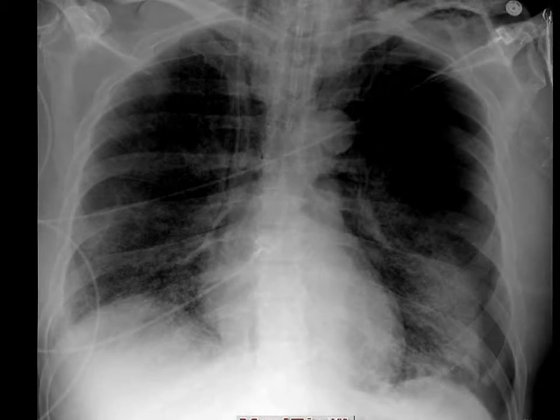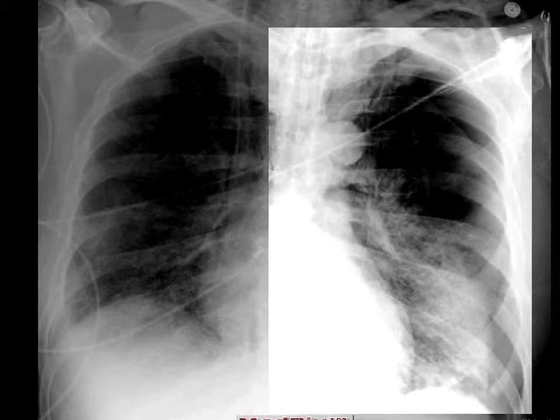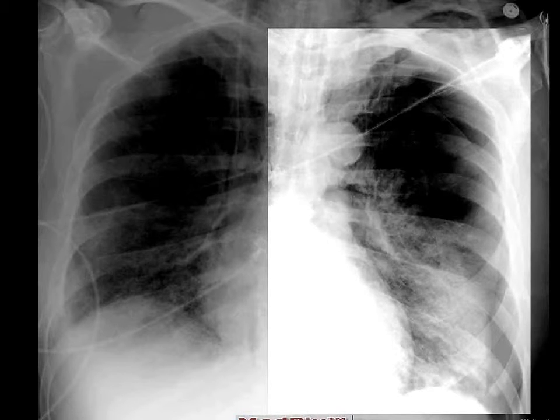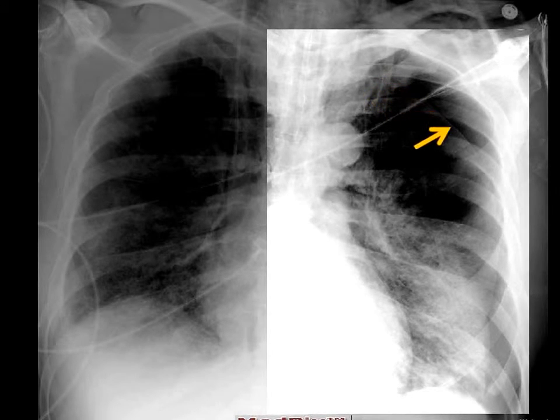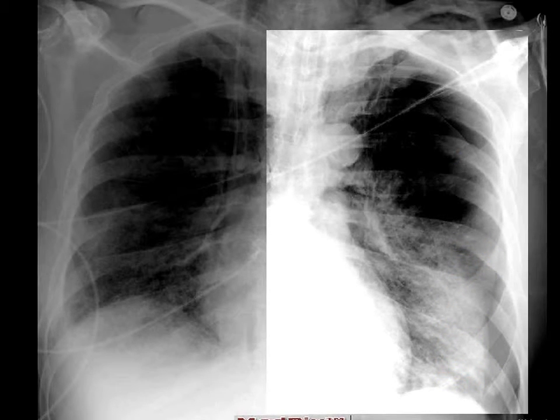Again, potentially resolving. We take a look at the left lung field, however, and we'll improve the brightness on this film. We can see that the vascular structures of the lung do not extend completely to the chest wall, and there is a hypodense area in the apical lung field against the slightly more dense lung. This produces an edge, which is seen here. It continues around the lung field and continues inferiorly and is seen here. This represents, of course, a pneumothorax.